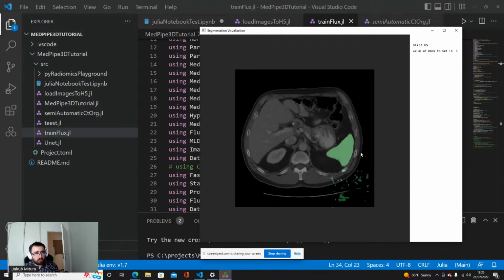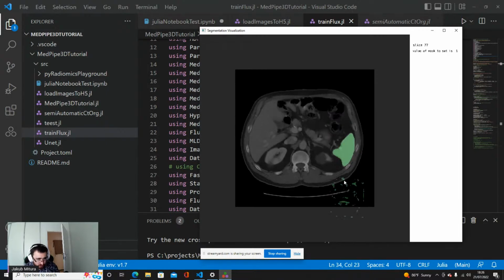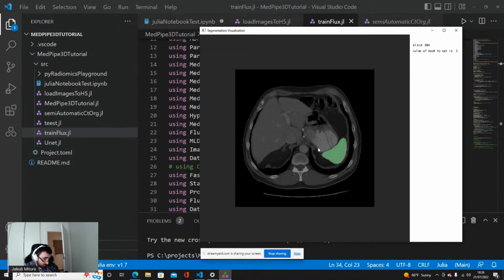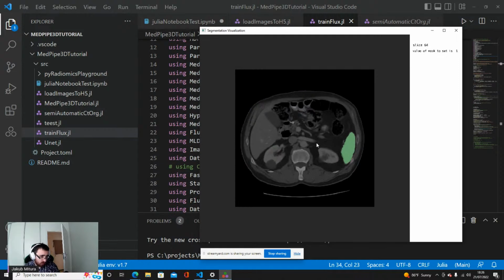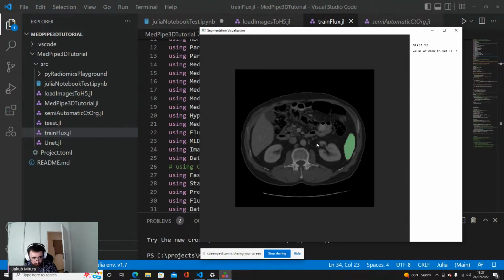Okay, so this is the output of the algorithm. This is a spleen, and this works extremely well to see the spleen. As you see, it's extremely well describing where the spleen is, and this is a very simple U-Net, very simple process. Although it has a lot of artifacts, as you can see. I do not know exactly why this happens, but I have such artifacts, and this is some problem of the U-Net. Probably this is related to the fact that this is a 2-dimensional U-Net that is implemented in such a way in order to reduce the memory consumption.